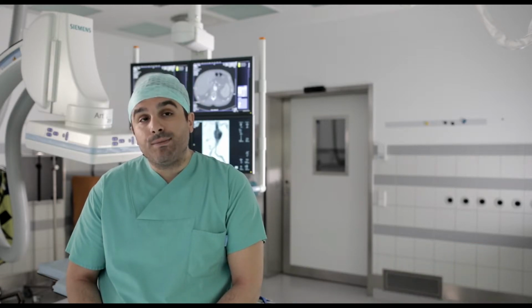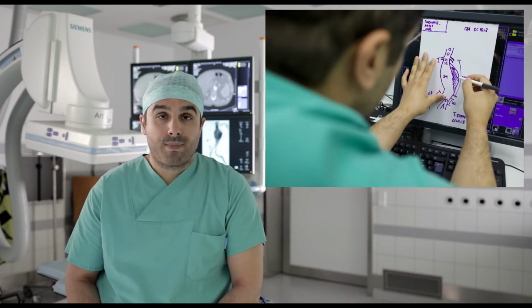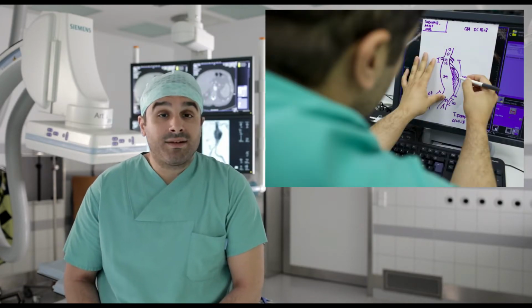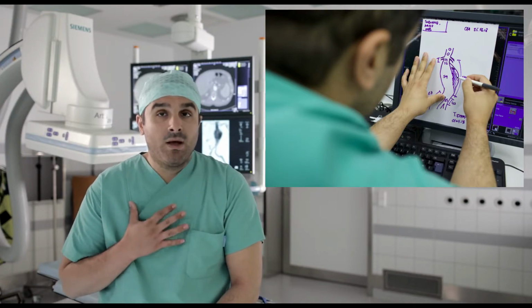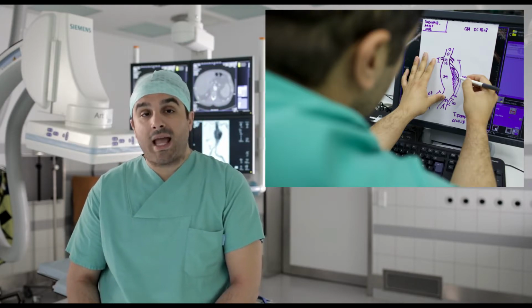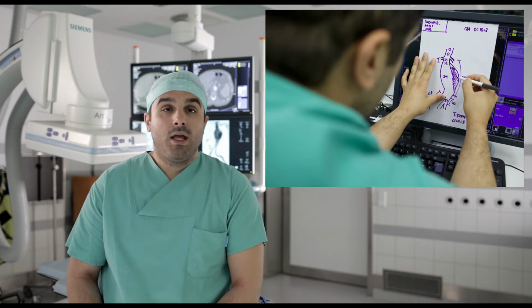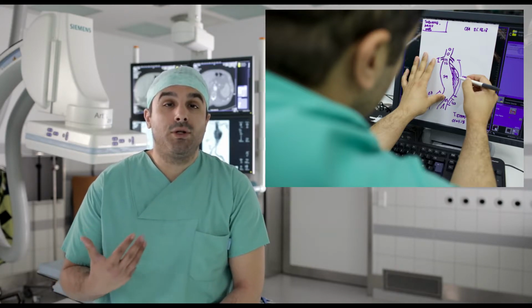In my opinion, the most important step is to draw the aneurysm in a sheet of paper. This strategy has several advantages, which, believe me, will change your daily practice with the treatment of abdominal aortic aneurysms. You have to document your planning in a way that it is reproducible.